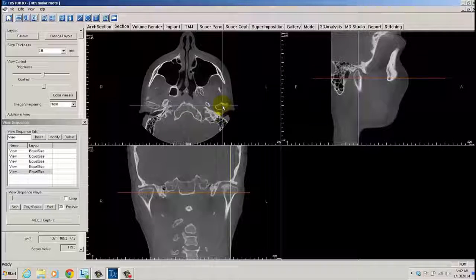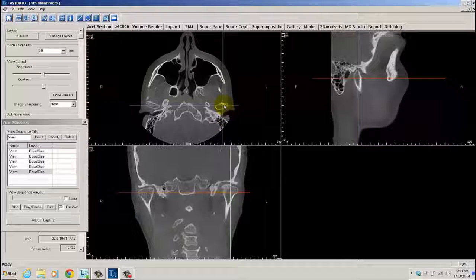If you would like to magnify a frame before insertion, you can do so by holding down the Control key on your keyboard, and while holding down the left mouse button within the desired view window, move the mouse to magnify the frame before insertion. You may also hold down your keyboard's Shift key and left mouse button while moving the mouse to pan through the image within the view window.